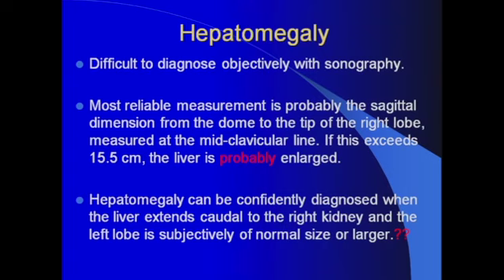Now, the problem that we encounter in imaging as radiologists is that whenever we deal with a 2D image, quantification of the size of organs is somehow difficult and inaccurate. We have known that fact for many, many years. The only way to establish correct measurements of organs in the abdomen, like the liver, spleen, and kidney, is to invest more time in doing volume measurements, which in practice may not be practical for a radiologist and can be time consuming.